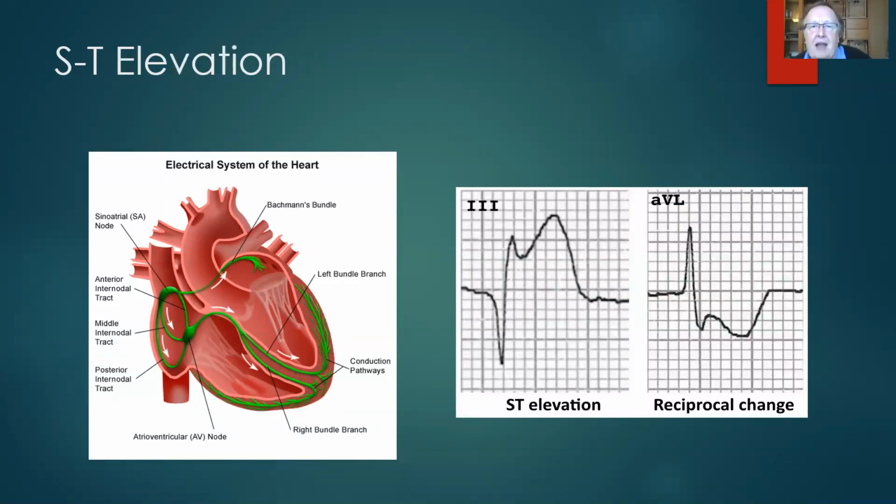Here we have ST elevation. As a paramedic, when we see this, we go, hoo-hoo, at least we know what we're dealing with here. A barn door ST elevation, you know where you're at. Now, somebody asked a question the other day when I was delivering this, but what about a high takeoff? And I'm going to say this to you. You might not agree with me, but I'm going to say it anyway.